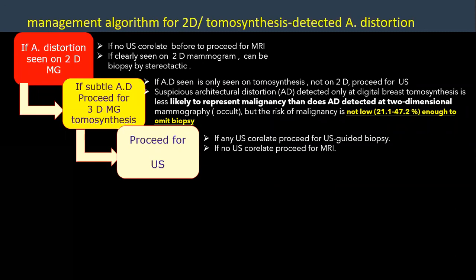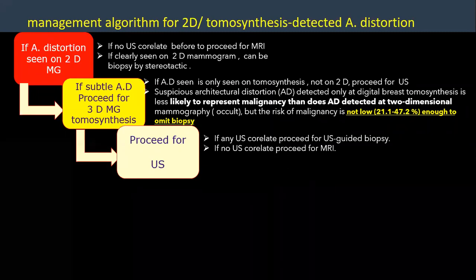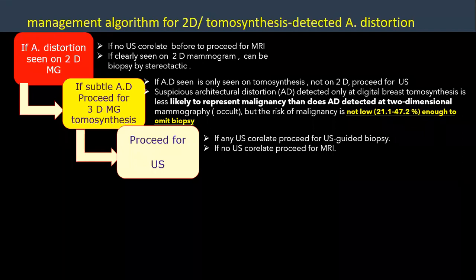If you can detect a lesion at the site of the abnormality sonographically, you can use it as guidance for biopsy.